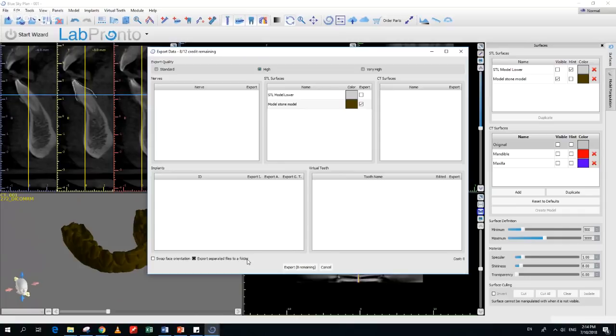Because we now have this free export, another interesting trick is that if you have a large model, because model sizes have been growing exponentially. Well, a few years ago, a model might be 5 or 10 megabytes. Today, when you import models from relevant scanners, you could be hitting 200 or 250 megabytes. And that could really bog down your machine.